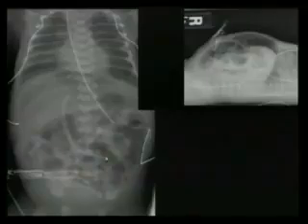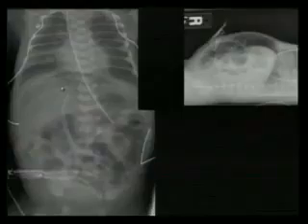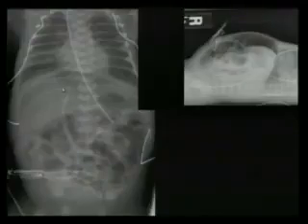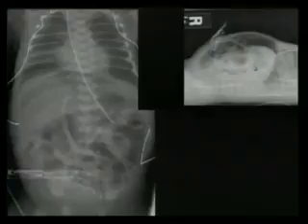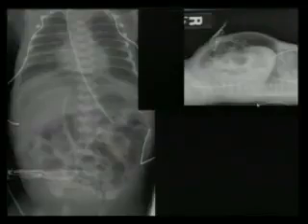In this NICU setting, this is NEC, and now they've perforated somewhere. You see this, you call the NICU up immediately. You talk to the doctor, you tell them the baby's perforated, they need to consult surgery stat. Because a lot of times the surgeons might not be as good as us at seeing this, especially if it's more subtle, tell them to do a left lateral decubitus. Don't say do a decubitus view of the abdomen. You say do a left lateral decubitus of the abdomen, right side up.